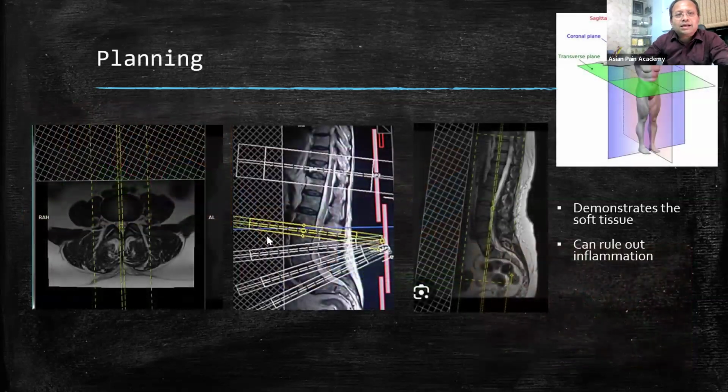Of course, to interpret an MRI you must know the planning. This planning part is done by the radio technician. You see the lumbar spine area. It is not that the whole spine is seen; it is only the area which is important. See the disc space area. Only the disc space area has been scanned, not the lower sacrum part and all.